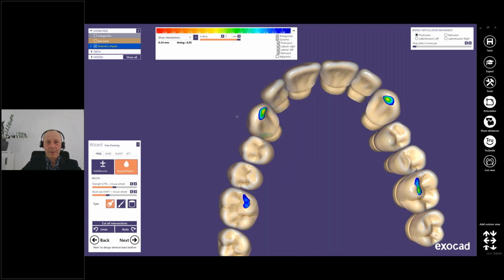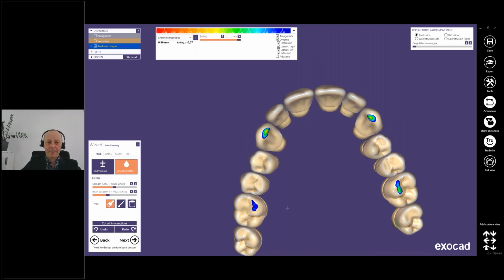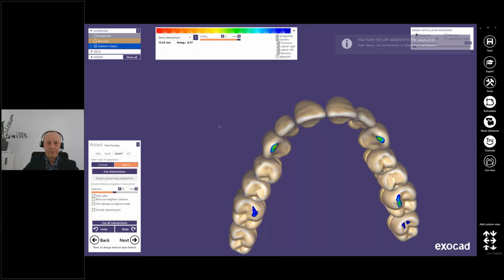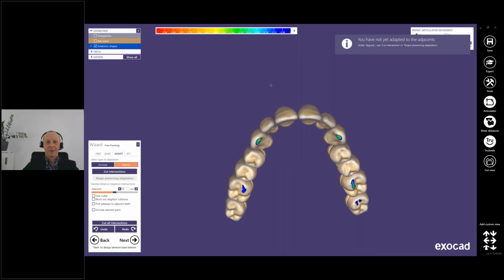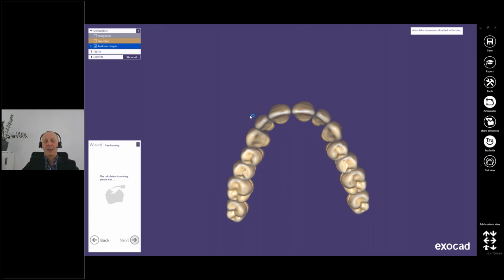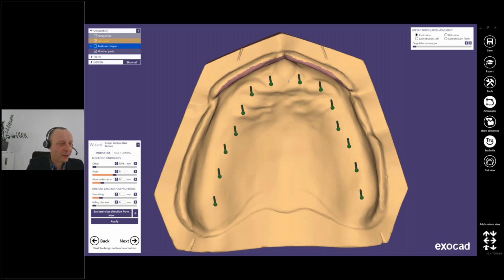So now the guidance should be fine. Okay. Next, I ignore further adaptation. It is good for me. I don't need distance anymore. Pina, do we have some questions about the libraries and adaptation so far? Not yet. Everything is fine. Okay. You can continue. Thank you.